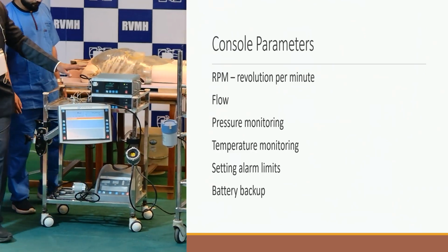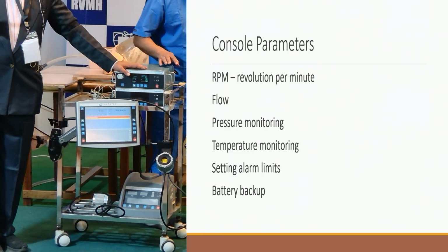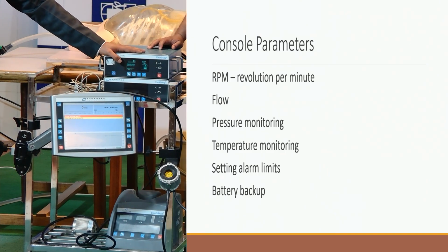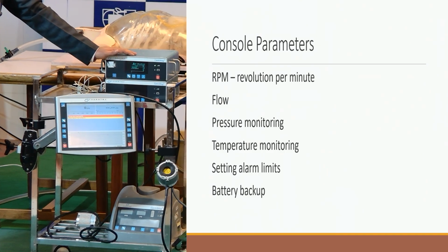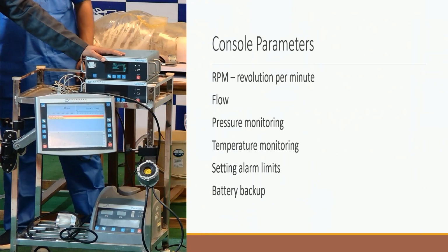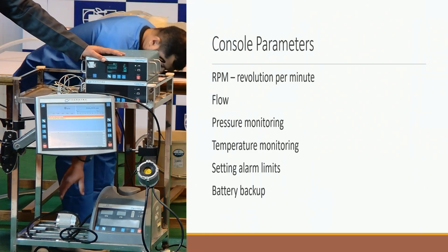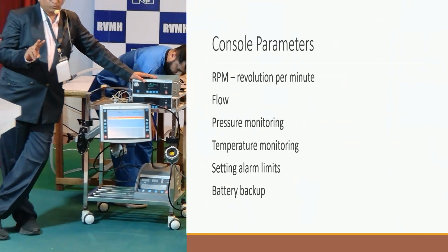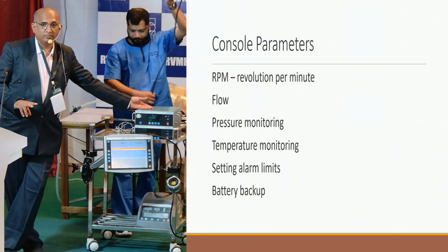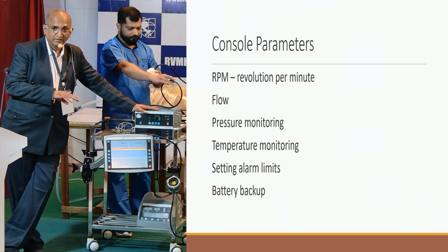Similarly, in Centrimag, they provide you two consoles and two external motor drives. So each Centrimag machine, when you buy one, they have two consoles and they will provide you two external motor drives. Okay, so suppose one stops, you can immediately switch over to the second.